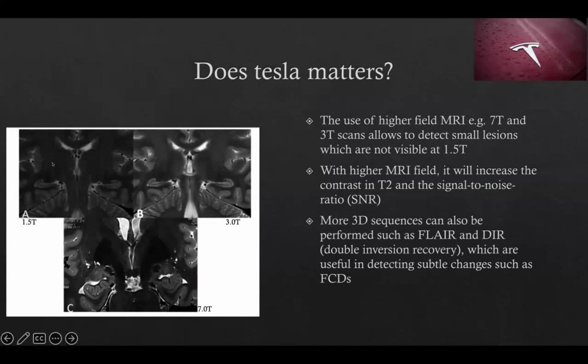If you compare, the upper left image is 1.5 Tesla, the upper right image is 3 Tesla, and at the bottom is 7 Tesla.